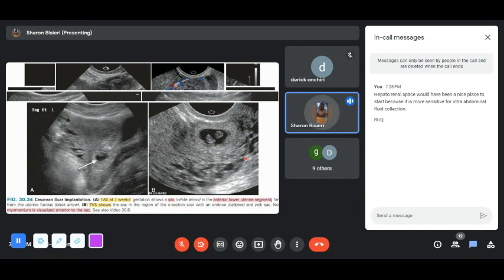If you compare it with the previous image, there you could clearly make out the anatomy of the cervix on your ultrasound image. But in this case, you can see how the surrounding tissues are distorted. Combined with the history of this patient who had previously had a cesarean section, they were able to conclude that this is implantation on the cesarean scar.